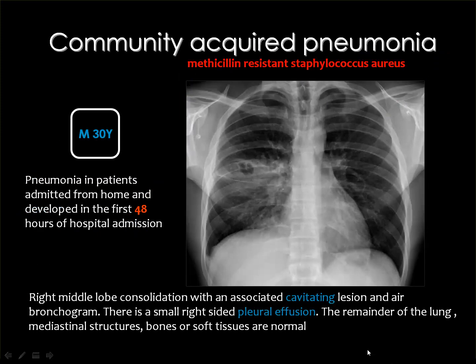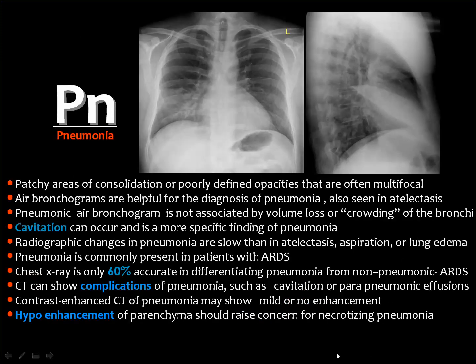Then, according to the literature, the presence of central areas of breaking down or cavitation is one of the supportive diagnostic signs of pneumonic consolidation. But you know that the presence of opacity with air bronchogram and obliteration of the adjacent landmarks in the chest, together with the known silhouette signs and maybe the presence of some pleural effusion, are some of the supportive criteria.